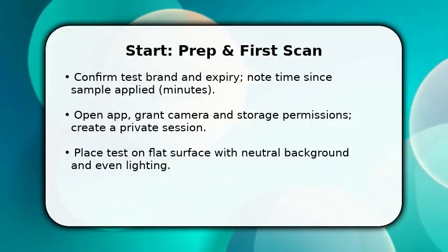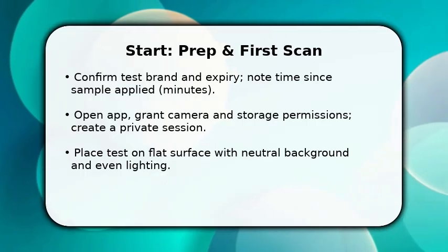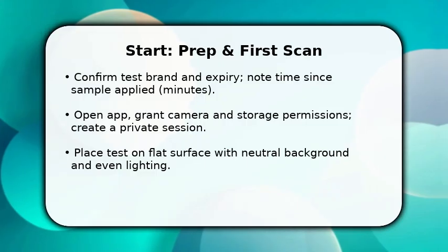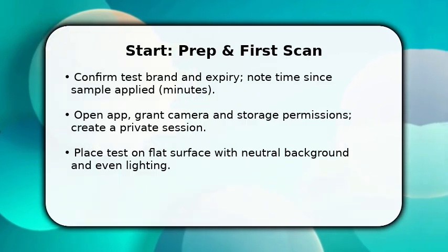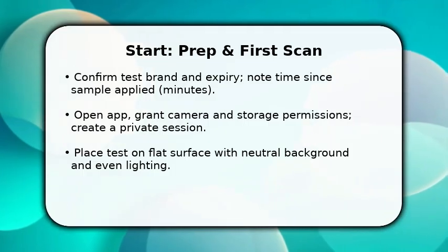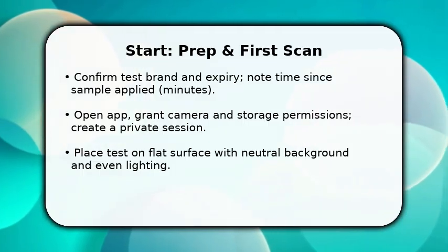You already have a valid test and your phone ready. Let's begin. First, confirm the brand and how long it's been since you applied the sample, because timing affects result visibility. Once done, open the app and grant camera and storage access so the checker can analyze the image.